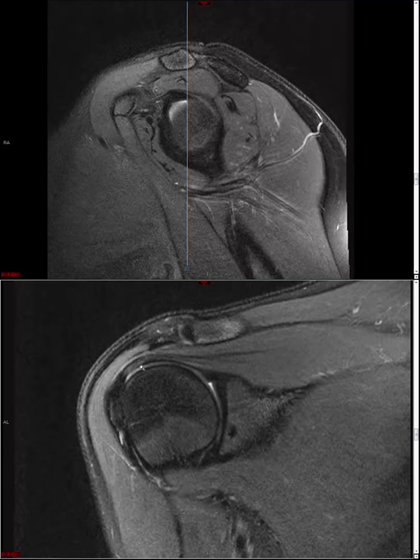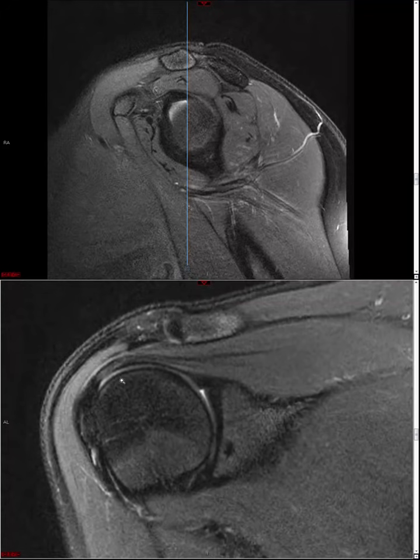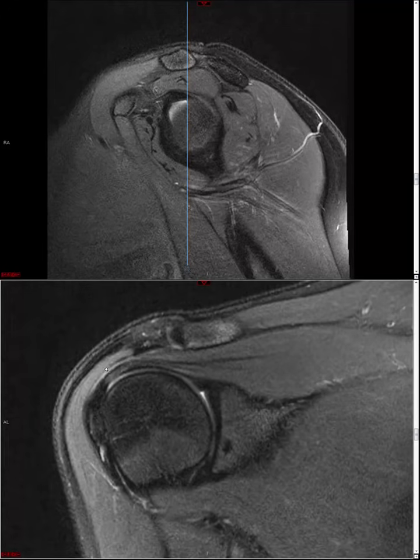Okay, so let's deal with full thickness cuff tears first. If you see a full thickness cuff tear, i.e. one that involves the entire cross-sectional thickness and therefore extends from the so-called articular surface, so this surface here which communicates with the joint, and then this surface here which is the bursal surface, then you have a full thickness cuff tear. And if you do see such a tear, once again you should say which tendon it's in.